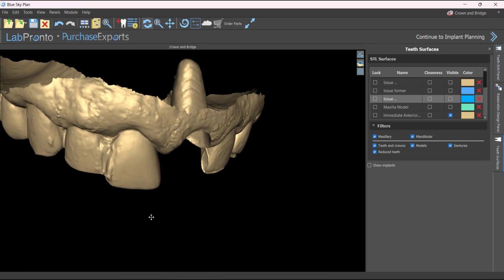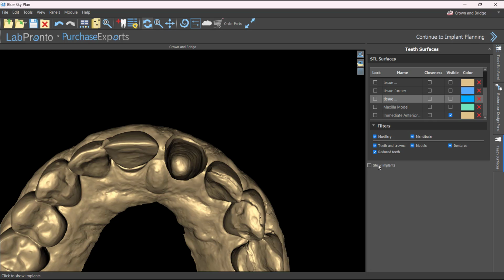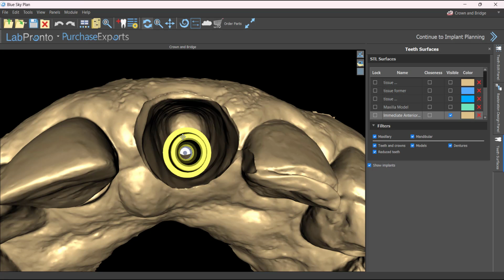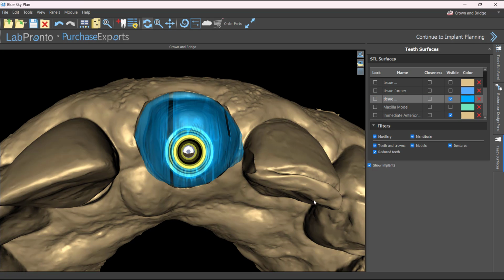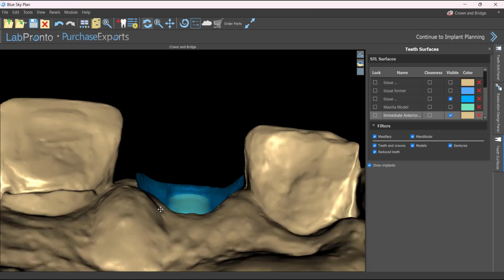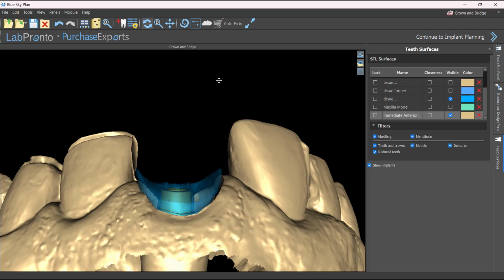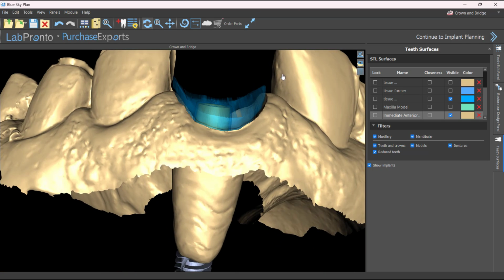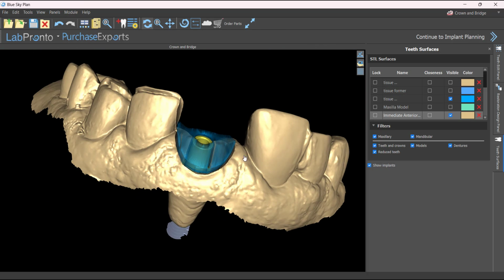So when that tooth is extracted, this is exactly the anatomy that's going to be present. You could do your implant fully guided so that you know it's going to end up right there. And then you could have your custom tissue former that you've created. All right. So I'm showing lots of options. Obviously, I've gone way overboard with this because I'm just trying to show you all the possibilities that exist. But really, you're limited only by your imagination.